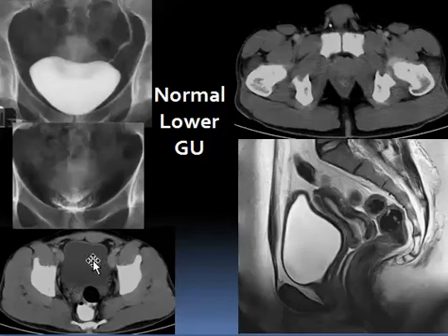This is the bladder delineated, filled with fluid, and this is the rectum filled with contrast. Sometimes we do such a technique to visualize more the interface between the bladder and the rectum.